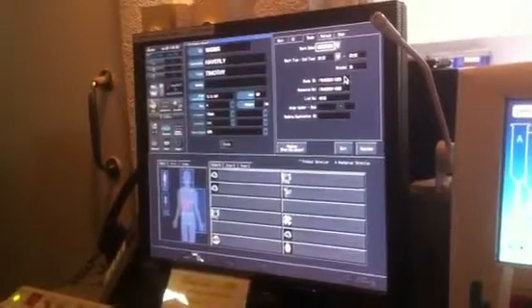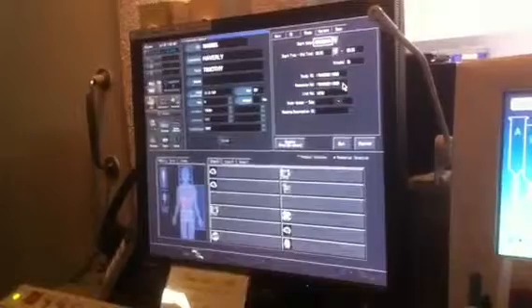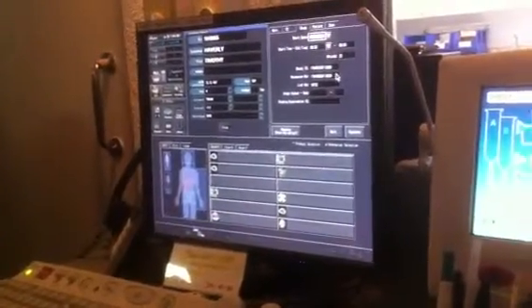I think this study ID and this session number might have been for the... Oh, that is the pelvis. Because it's right over here too. So it already has it. So the next thing I want to do is split that off from the rest.